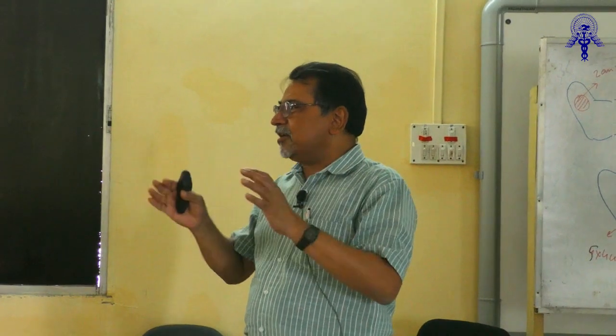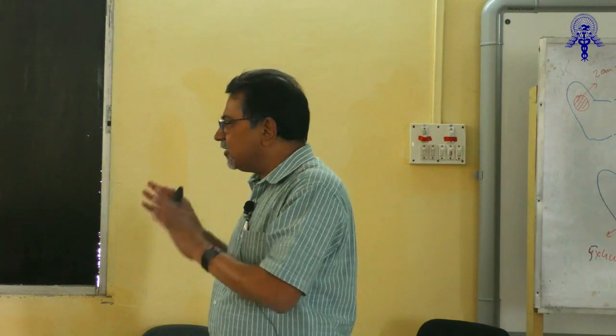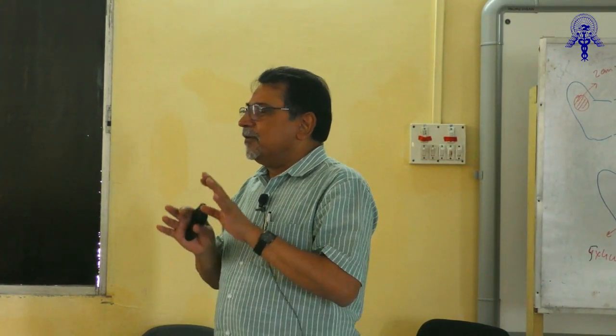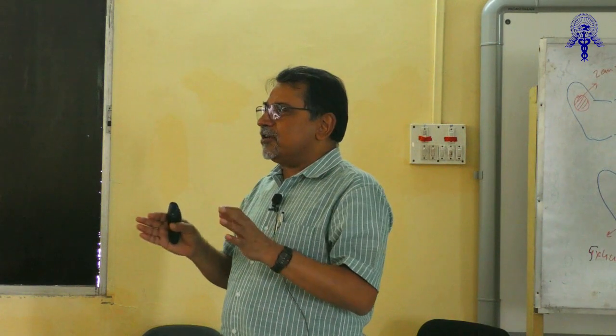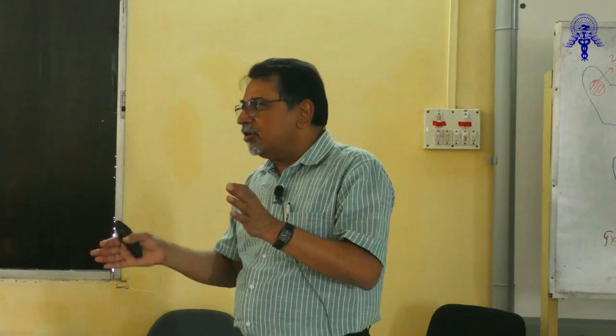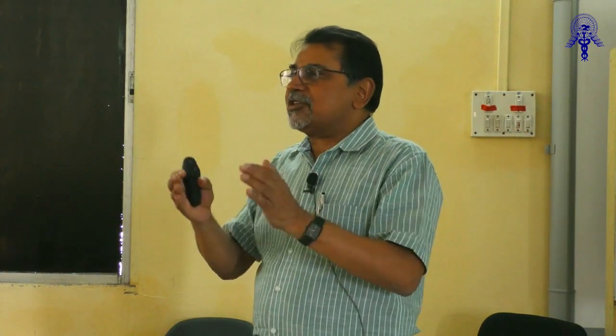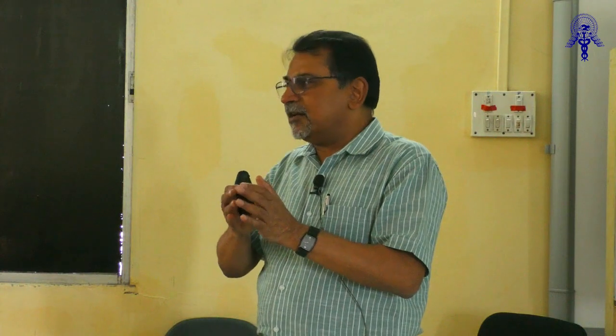there will be a lesion or a mass in the posterolateral aspect of one-sided nasal cavity, if it is small, and from there, in the region of the sphenopalatine foramen, the mass will extend and erode possibly the pterygoid plates, medial and lateral. It will enter into the pterygopalatine fossa. It is likely to have destruction of the posterior wall of the maxillary sinus and spread into the infratemporal fossa and beyond to the skull base, superior orbital fissure.